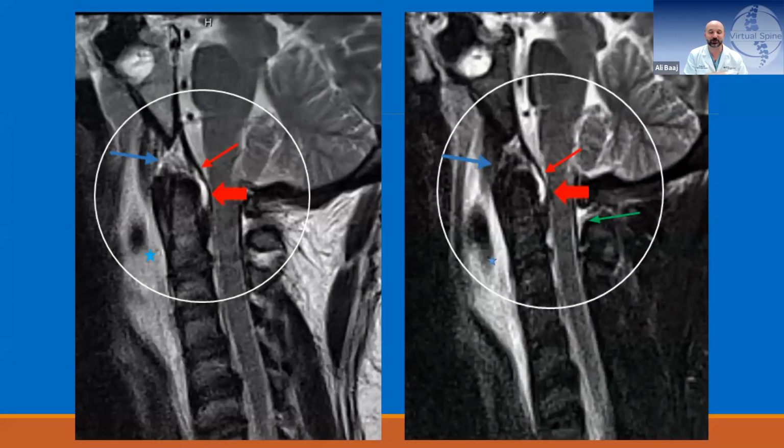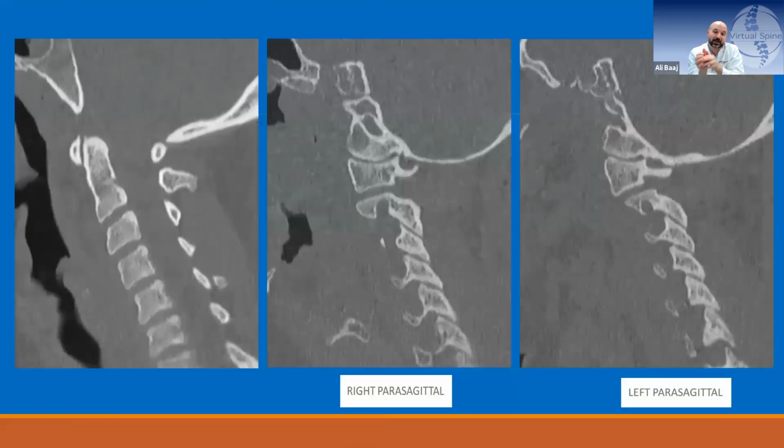This is a personal feeling, just a personal disclaimer. I think MRIs a lot of times would push surgeons towards operating, because they're going to pick up things that CAT scans aren't. It's not necessarily always right or wrong, but the data is the data. What you see is what you see. So Jonathan, what do you think? If you saw the CAT scan, what would you do? Now the ER, behind your back, gets the MRI. Now what do you do? And what do you tell the patients? This is a really tough case, I think.